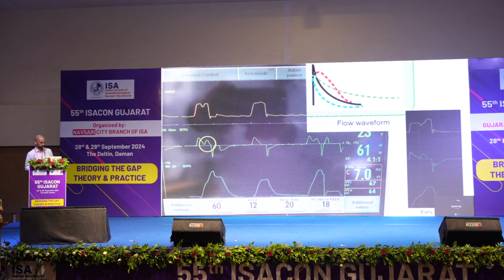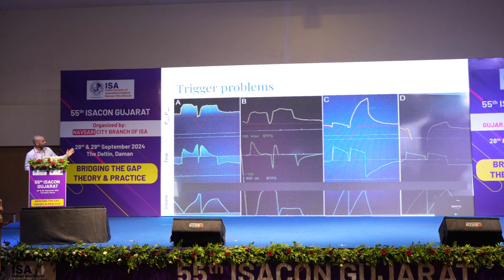It can lead to a double trigger, but this is early trigger or reverse trigger. Other trigger problems are, all of these are double trigger, and frequently in exams I see this error. People just call it double triggering or double stacking. Double stacking or double triggering is an observation. There is an underlying abnormality that you need to define, just like fever is not a diagnosis. So these are the 3 different types of things that you see.